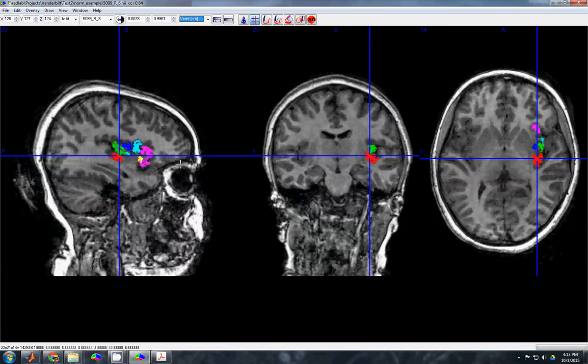Okay, so as you can see by the mistakes I'm already making, you really want to make sure you're keeping the numbers correct. You can make a little reference sheet. I think I might have one of those that I'll attach as a link where it actually puts the number on each region to make sure you're labeling things correctly, because we'll have a lot of trouble finding overlap if different people are calling different regions different things.